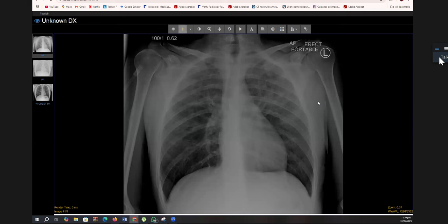Given this story, what do you think the diagnosis might be? Sorry, sir. Given the story I've just given you, what do you think the diagnosis might be? Sir, can you please repeat the history? Dry cough, fever in the middle of the COVID pandemic.